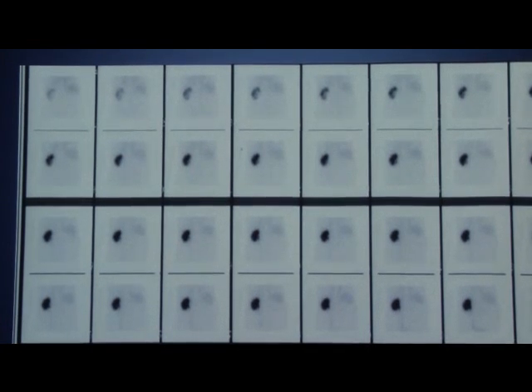In this renal scan of the functional phase, you can see the right kidney atrophy. Obviously, the right kidney is the one that is not visualized on the scan. In this renal scan of the functional phase, we can see that the patient has polycystic kidney disease.